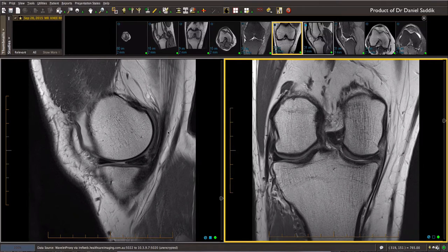Okay, so the reason why I want a sagittal PD is because that is the most sensitive sequence for a meniscal tear. The PD fat saturation sequences add sensitivity and specificity to the diagnosis, but they are nowhere near as sensitive. Most meniscal tears, as you may or may not know, are picked up on the sagittal PD imaging. Other sequences can pick up the meniscal tear, such as the coronal sequences, but generally, if you had one sequence, it's the sagittal PD to pick up a meniscal tear.